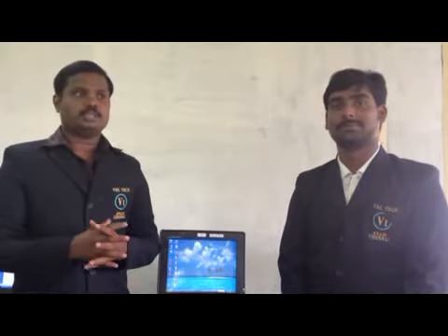So the main aim of an engineer is to make these exudates, hemorrhages and other symptoms visible in a fundus photograph. Several techniques have been proposed in order to detect these exudates.